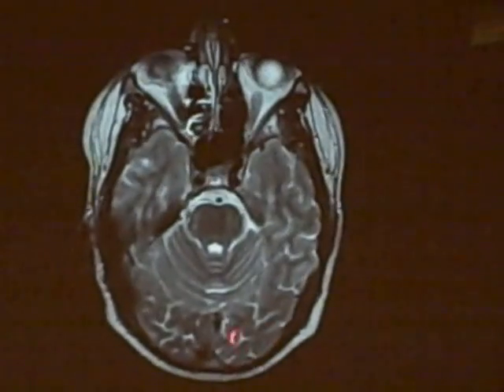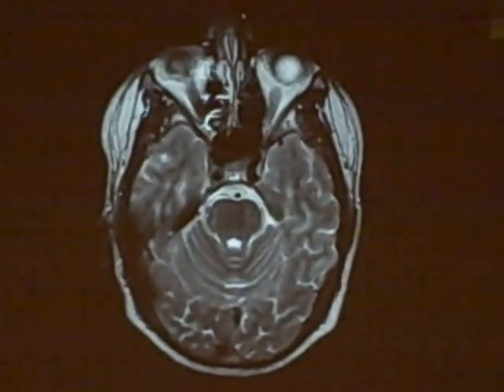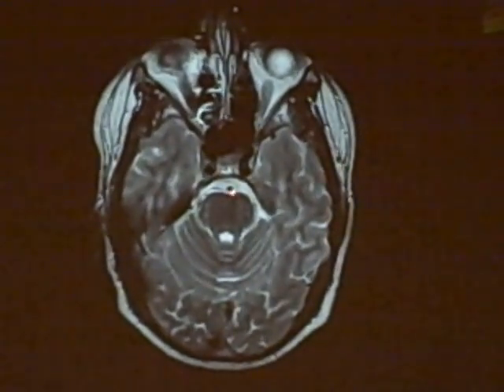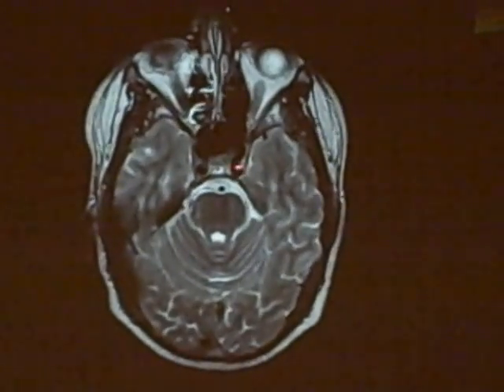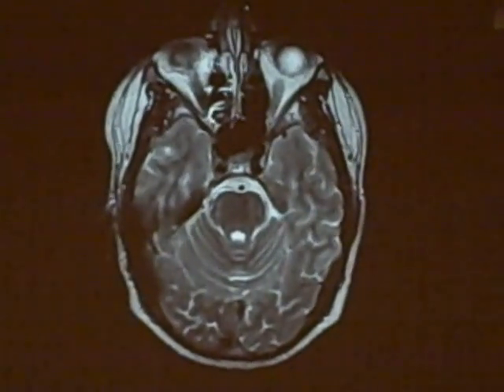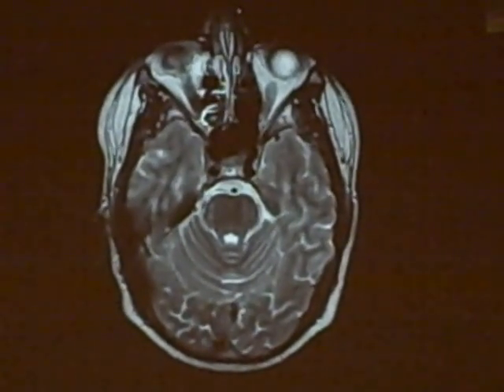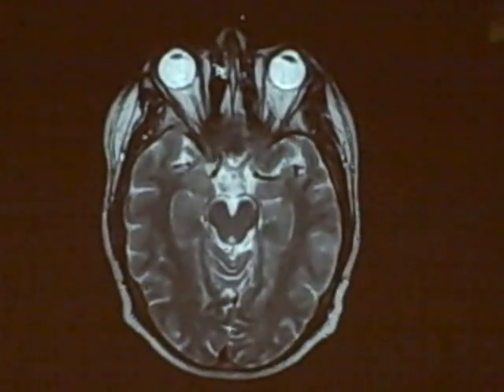And lying above the cerebellum, of course, we have the occipital lobe right here and the temporal lobe. Okay, so we look always for these blood vessels here, basilar, but also the internal carotid arteries. And up higher, we'll want to be able to distinguish the middle and the anterior cerebral arteries. Okay, which we can right here.